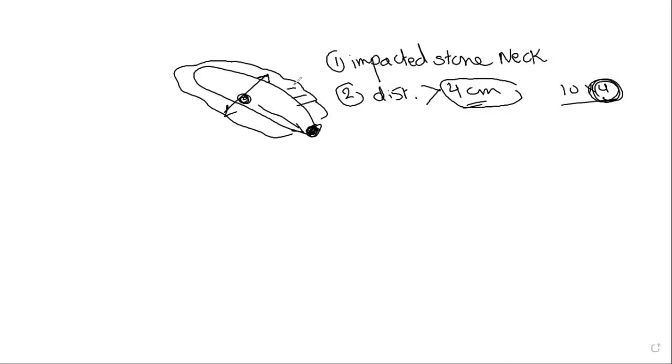Now this poor gallbladder has an obstruction ahead of it, and it is distended, so what will happen? The muscular wall of the gallbladder would start to exert enormous effort in order to overcome this obstruction. Thus, this would make these muscles hypertrophy, so they would increase in thickness. So the third thing is increased gallbladder wall thickness.